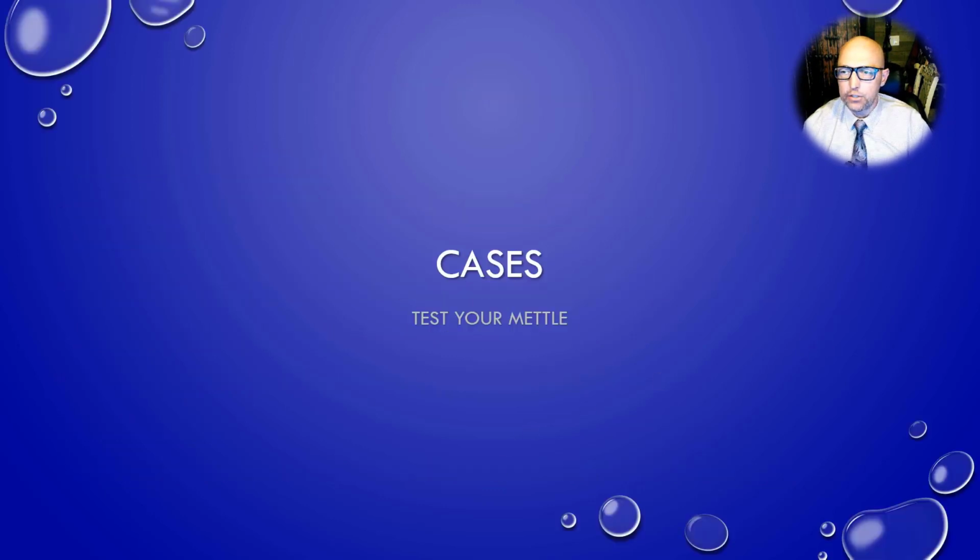All right, time to test your mettle. Give you a chance to look at these and come up with your best guess to what you think it might be.